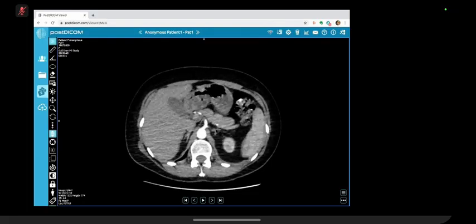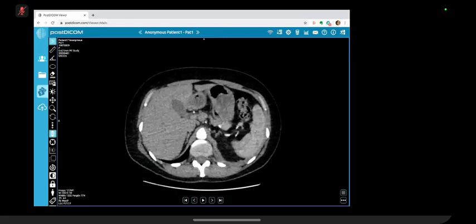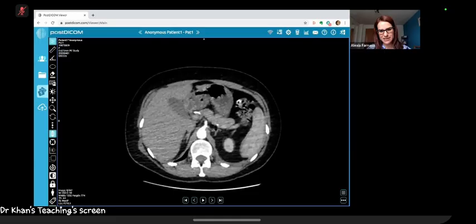Okay, so it's coming off of the SMA. The celiac, actually. Celiac, apologies. You couldn't tell because you didn't know there was a celiac coming off above it. Yeah. This is the celiac trunk. So it's coming off the celiac trunk.